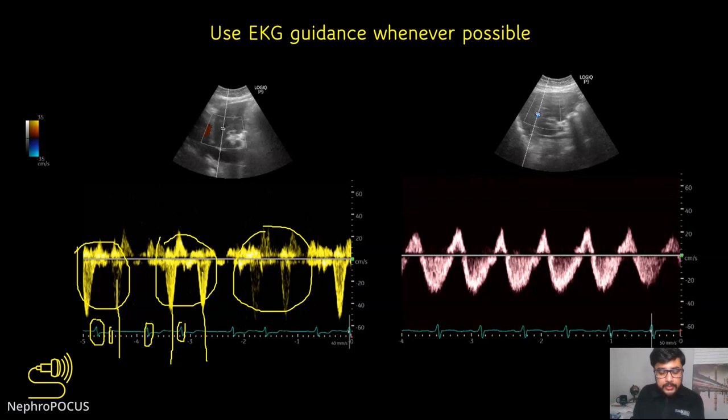And here is another nice example where you see the diastolic wave starting in one part of the cardiac cycle, extending over the QRS complex of the next cardiac cycle and going till the next T wave. So this is the fusion of D wave and S wave. We don't see the A wave in between, but you see the V wave. So the S wave of one cycle and the D wave of the previous cycle are fusing with one another. So this fusion can also be mistaken.